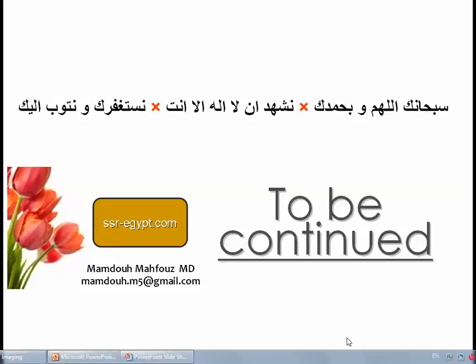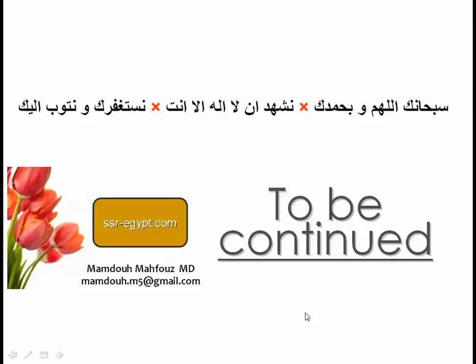Dear colleagues, now we will continue the topic of MRI, or imaging MRI, of the knee joint. We have started the evaluation of the knee joint, and we discussed the anatomy as well as the technical aspects and the meniscal pathology. Now we are going to continue this part discussing the ligamentous lesions.